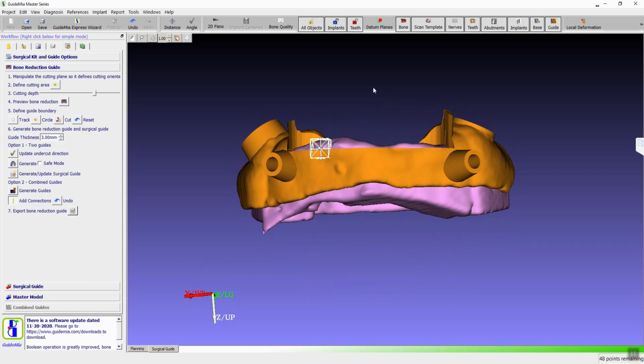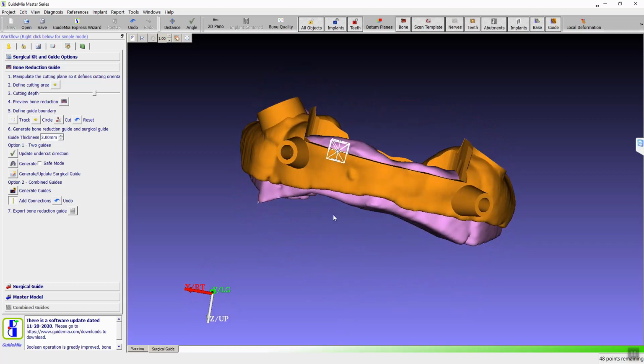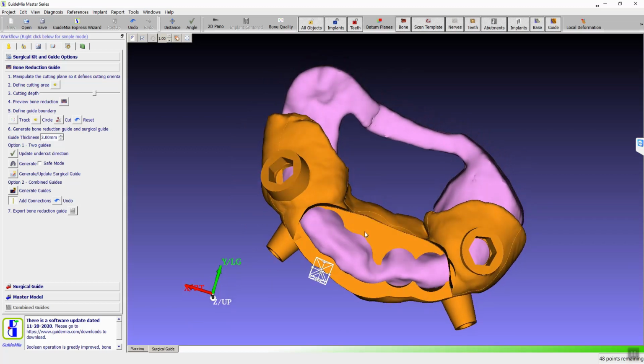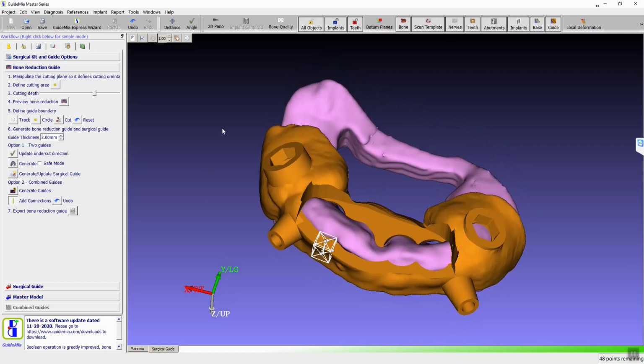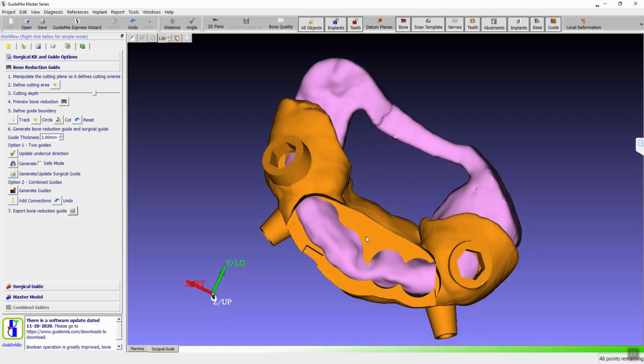We can do better, but it turns out that just a block is good enough, because you have to hold the guide properly anyways. So if we place that there, then we will finish this part. So we'll have a slot on here, and we have a protrusion on the first guide.